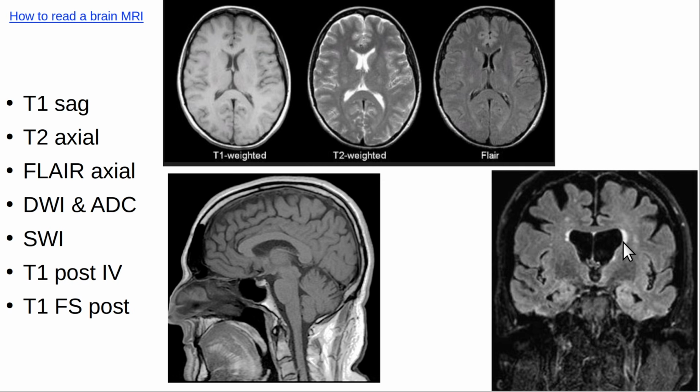You know, this is juxta. Juxta means yoked to, in contact with, juxtaventricular hyperintensity. This is near the ventricle, so this would be, well actually here's one at the level of the ventricle, so that would be called periventricular, okay? This level, by the way, at the level of the ventricles is called the corona radiata level. Below these lateral ventricles down here, this is called the basal ganglia level because these are basal ganglia. Above the ventricles is called the centrum semiovale because it's shaped like an oval when you're at that height of the brain. And it's semi-oval and it's in the center of the brain.